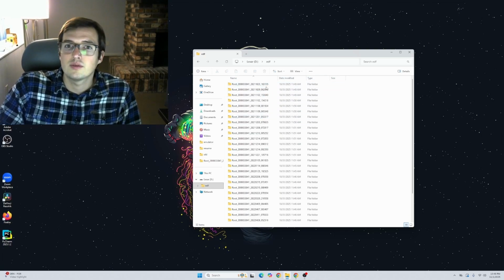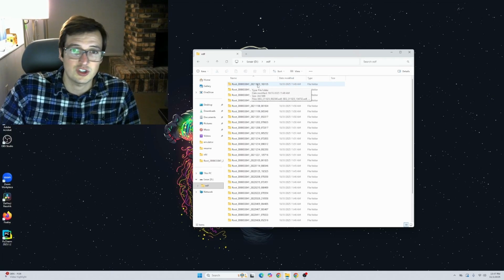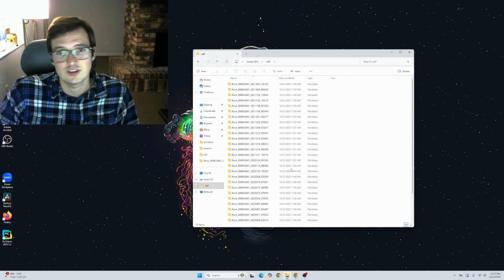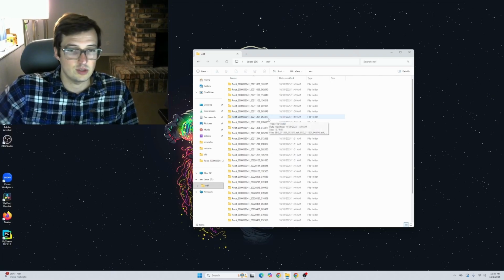But regardless, it thinks that this top folder is set to 2021-10, which is October 23rd, and it started at 4 p.m., so 1600, and then 31 minutes and 35 seconds into the hour. So 4:31 on 2021, October 23rd. That's what this name indicates. And then you have one folder for every single session, every time the machine was turned on and off.